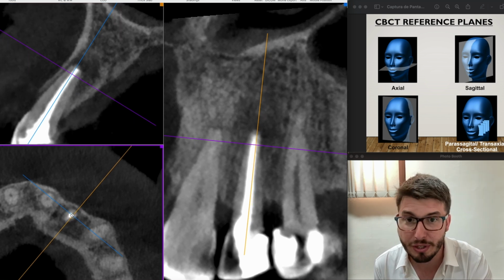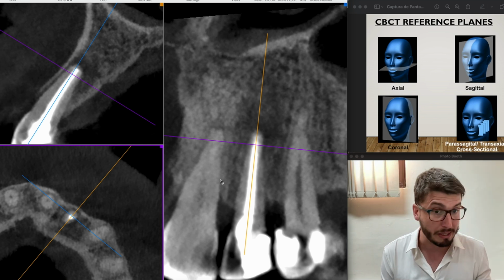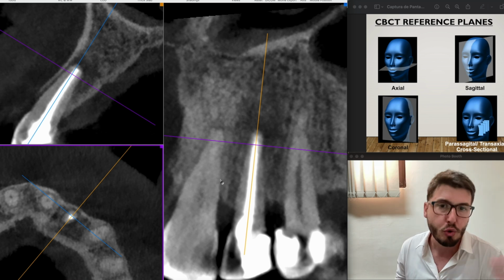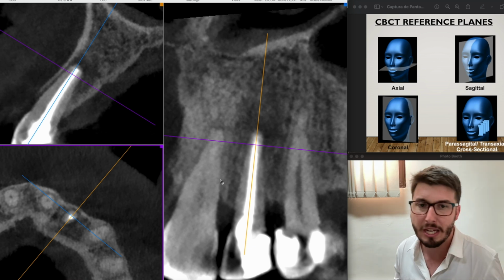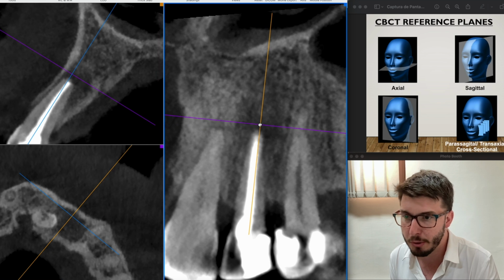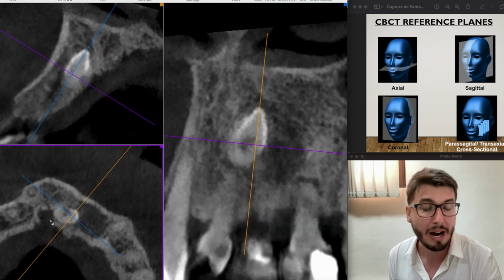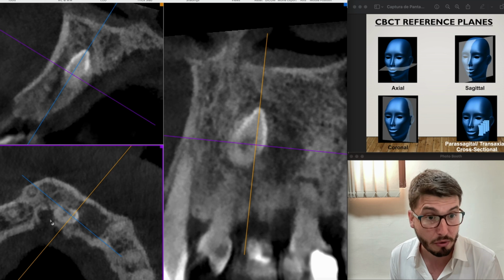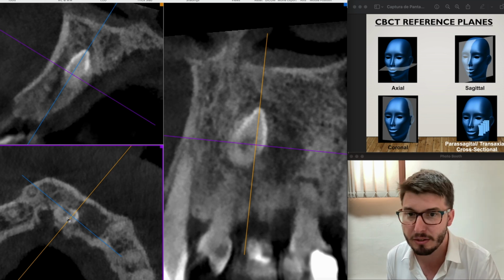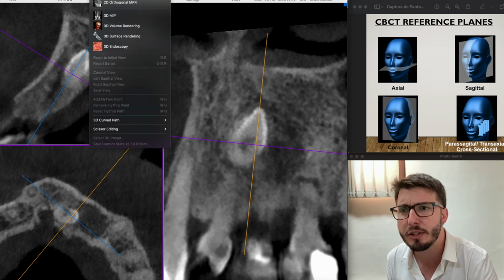And of course you need to do something about this. So of course this would be part of an integrated treatment plan. Okay, so we are not discussing antagonist arch occlusion and the physical examination, intraoral examination. We are just diagnosing this image here for the moment. Okay, but then we have the supernumerary tooth. So how to make sure this is a supernumerary tooth? Okay, and of course we need to count the others. That's basically the solution. Okay, so let's see this case first in 3D.